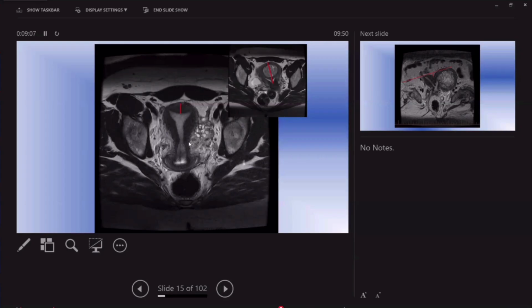So for example, this is the normal uterus that I was talking about. This is the measurement. If this measurement is 1 centimeter or less, I am dealing with a normal uterus. If it is more than 1 centimeter, then I am dealing with a septate uterus. The second case here is the one I was talking about. The outer fundal contour is convex, but you have a little indentation into the endometrium. So now I have to measure from outside down here. The total measurement is about 2.5 centimeters, so I am dealing with a septate uterus.